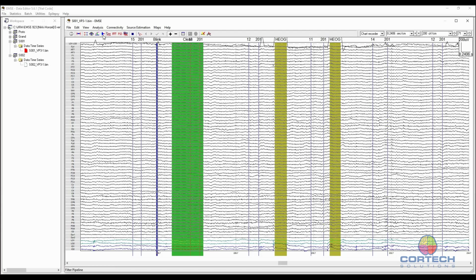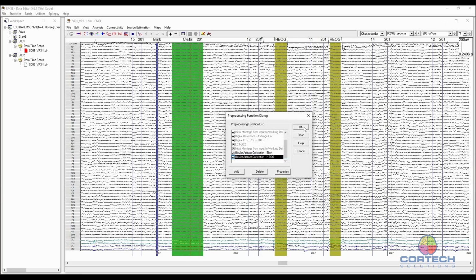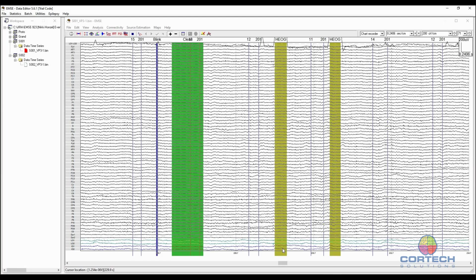I'm not sure if I change the number of components from 1 to say 3, if any of the subtle differences will be changed or not. Perhaps a little bit.